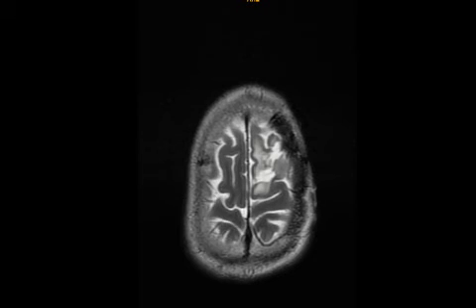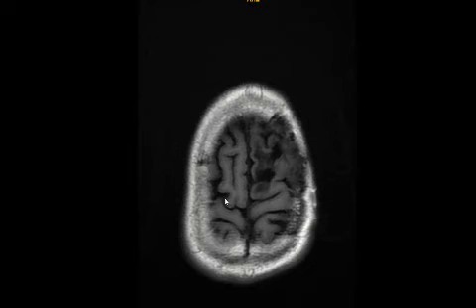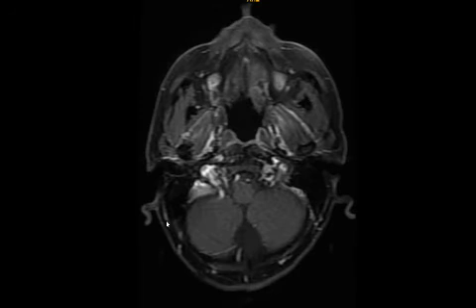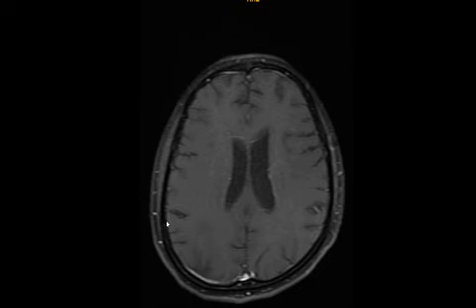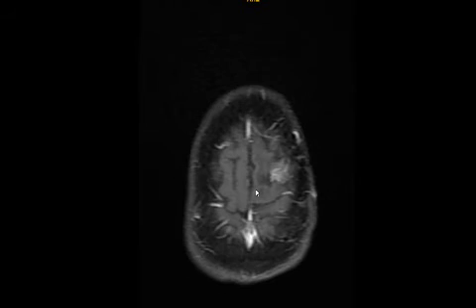Now I want to see T1 weighted images so that you will be able to compare with the post contrast images. Okay, it is isointense on T1. Let us compare it to the post contrast here. I'm not expecting much enhancement, though there is a bit of enhancement going on, which wasn't the case previously, mostly vessels and all.